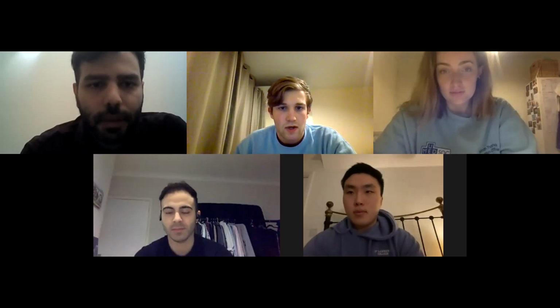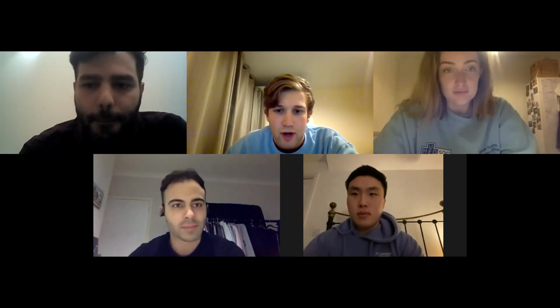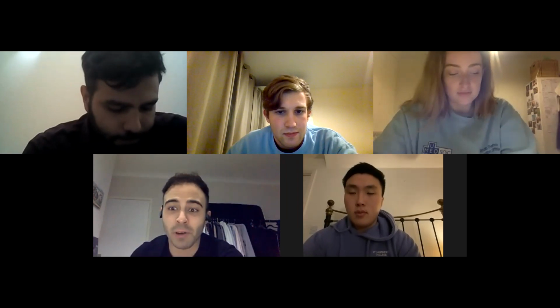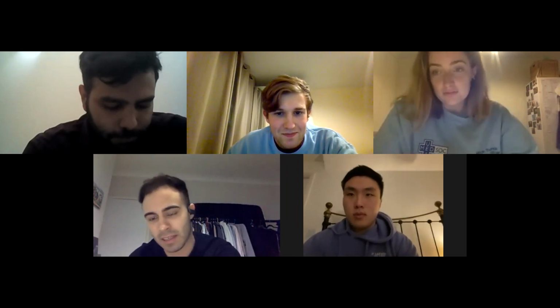Yes. Okay. And someone else has put in, what's the difference between atelectasis and pneumothorax? So a pneumothorax, there's air actually in the pleural cavity. With an atelectasis, it could just be a simple collapse of a part of the lung, but doesn't necessarily have to be air in the pleural cavity.